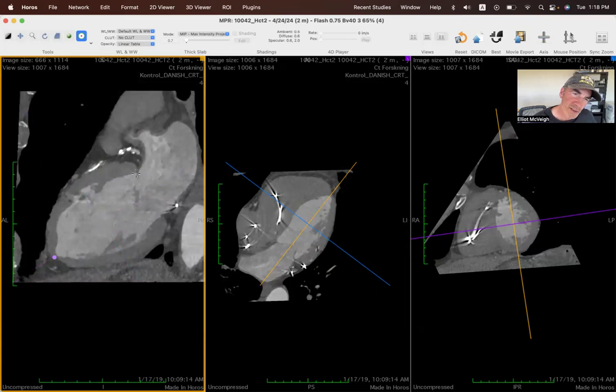The base of the heart is going to be halfway between this point and this point. It doesn't have to be super exact, but I'm going to say that's the base of the heart right there. Now, I don't want to put it above those two points. I'll just put it right where that is. We can click on the purple line to get the halfway point we want, which is right here, right? So you keep your eye on that, click it off, and you put your base here, okay?